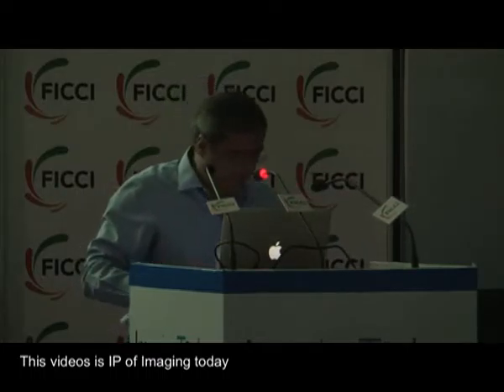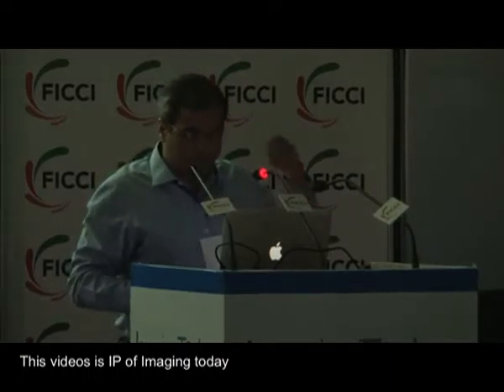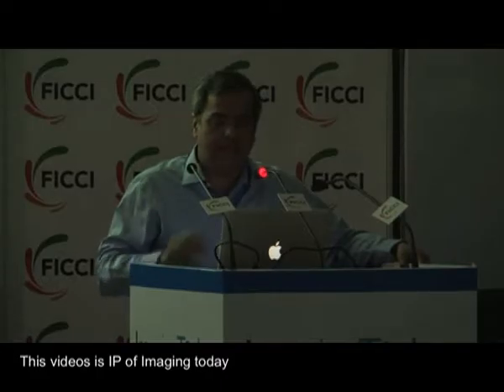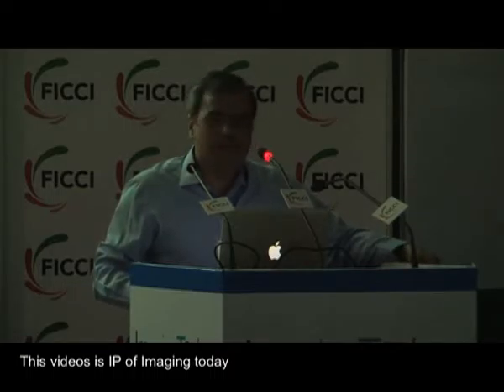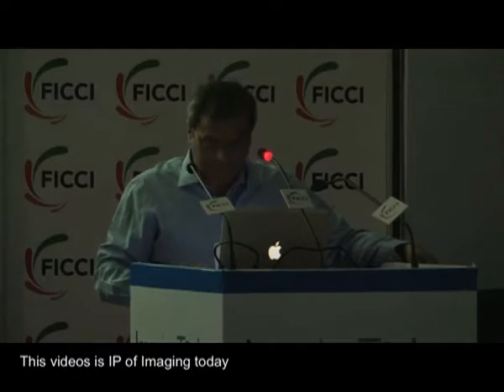Good morning, everyone. I'll spend the next 20-25 minutes talking about pseudo lesions of the liver. You've heard from Karthik how cirrhotic and even non-cirrhotic livers end up having all kinds of lesions, and it's important for us as radiologists to differentiate those lesions which need attention versus those that need to be left alone. Since a lot of us use many imaging modalities on a routine basis, a lot of these patients come for CT and MR based on an ultrasound diagnosis of a lesion in the liver.